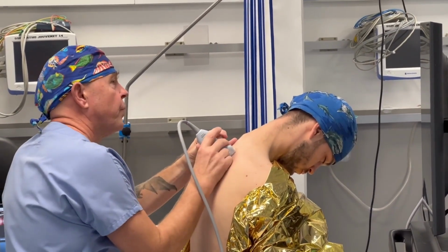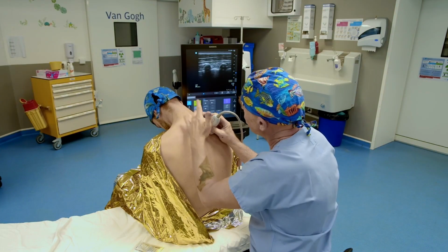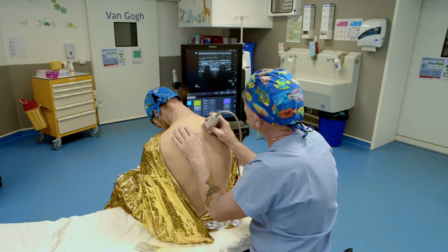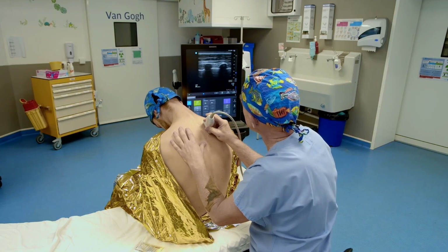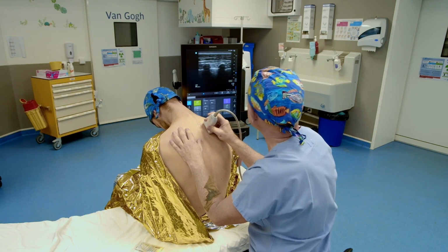Again, this raises questions about the level of punctures, the number of punctures, single or double punctures, unilateral or bilateral punctures. It depends a bit on your surgery, but here I refer you to all the more comprehensive manuals or websites that discuss this. They explain it much better than I do. There you go, we finished with this workshop.